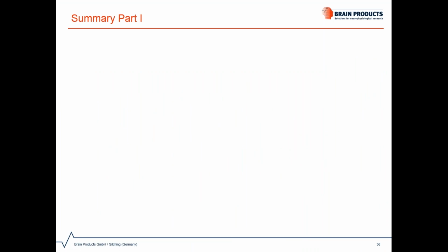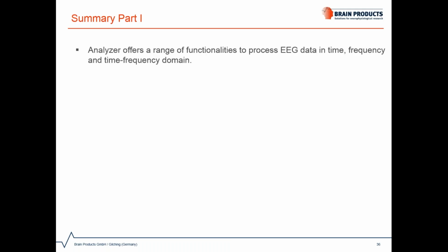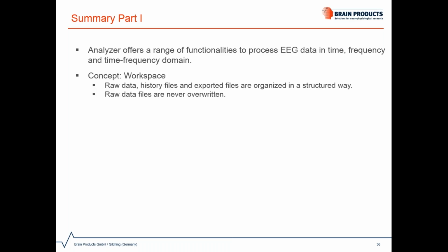So to summarize, under the transformations menu, we saw that Analyzer offers a great range of functionalities to process EEG data in time, frequency, and time frequency domain. To demonstrate the main concepts, I only showed you filter and change sampling rate. To start working with EEG data, we created a new workspace and learned what's behind this concept.